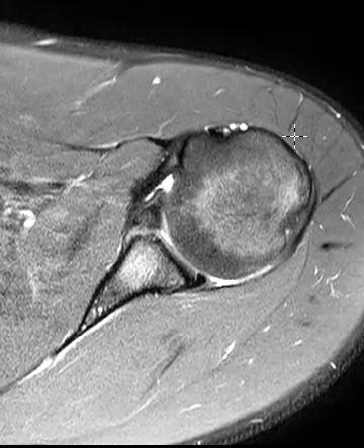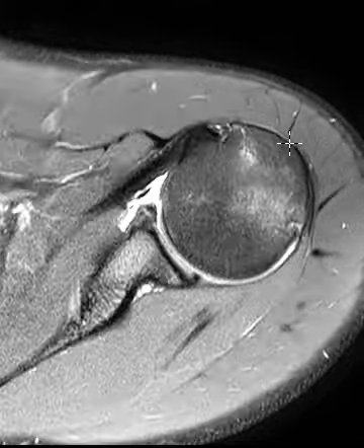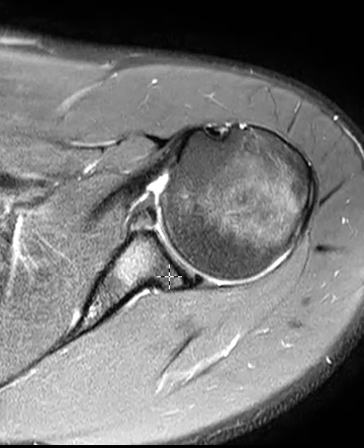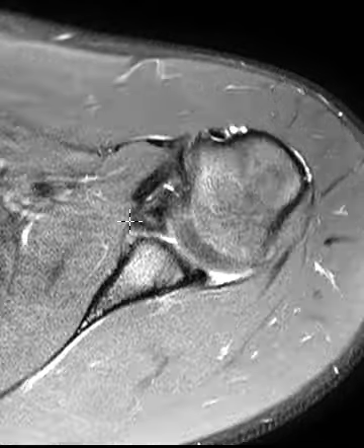This is an 18-year-old male with a history of prior shoulder dislocations. And we see here an axial proton density fat suppressed image of the left shoulder joint. We can see the round ball of the humeral head. We can see the glenoid here that looks like a golf tee. And the main problem is right here along the front. The anterior rim of the glenoid is fractured.